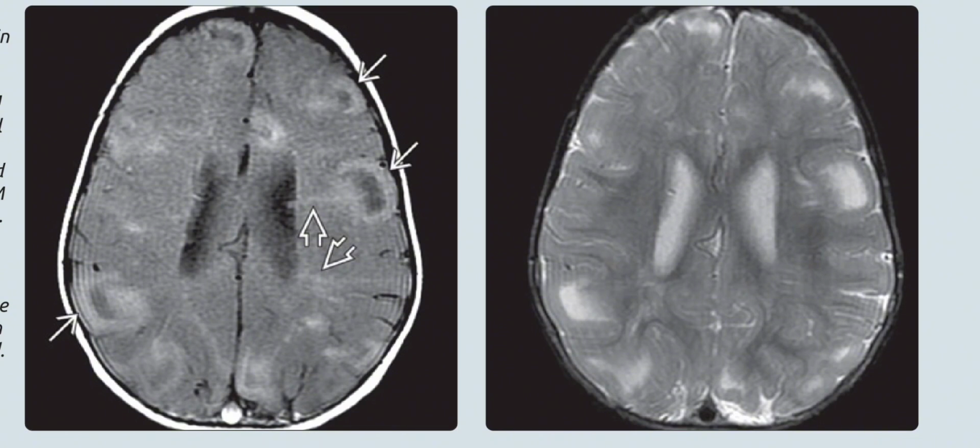Left is the axial T1 weighted MRI with magnetization transfer in a 13-month-old, and it shows classic findings of tuberous sclerosis, multiple cortical subcortical tubers, and white matter radial migration lines. These lesions are well demonstrated as the signal from normal white matter is suppressed by the MT pulse. Right is the axial T2 weighted MRI, and it demonstrates tubers as T2 hyperintense lesions beneath the expanded clubbed gyri. The white matter radial migration lines are not well appreciated here.